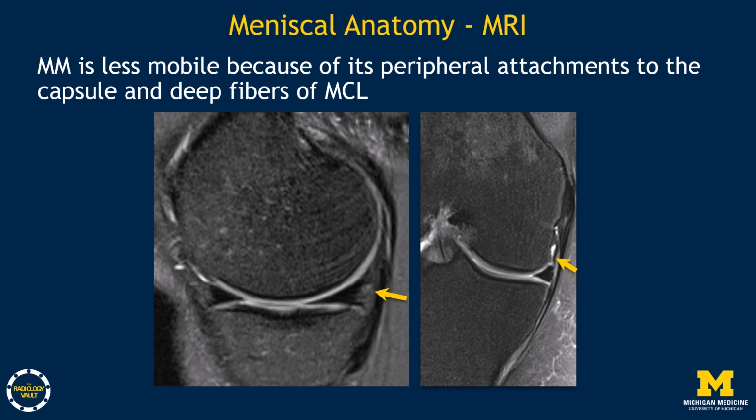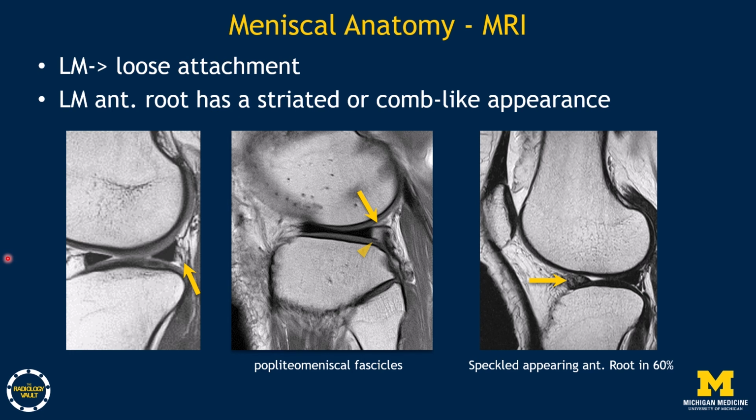On sagittal images, the menisci appear as either a bow-tie structure peripherally or opposing triangles centrally. On coronal images, the menisci appear either triangular or wedge-shaped. The circumference of the medial meniscus is tightly attached to the capsule and the deep fibers of the MCL, therefore more susceptible to tears. Lateral meniscus has loose capsular attachment and lacks direct attachments to the LCL.